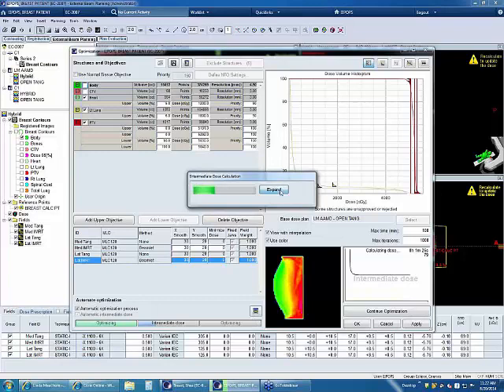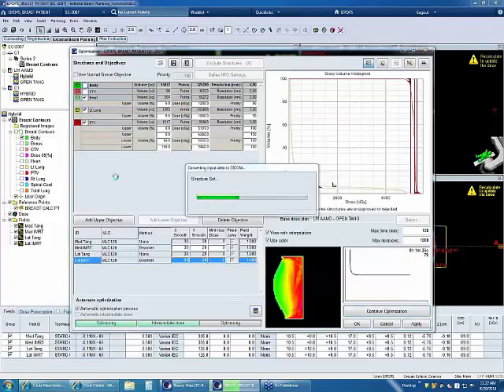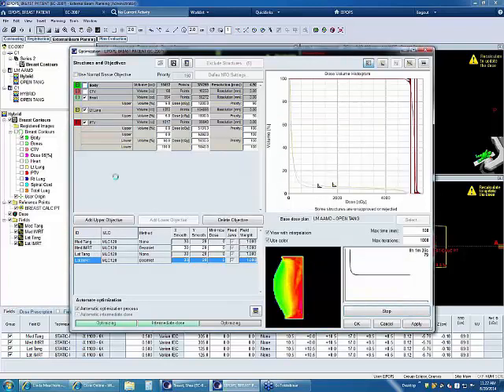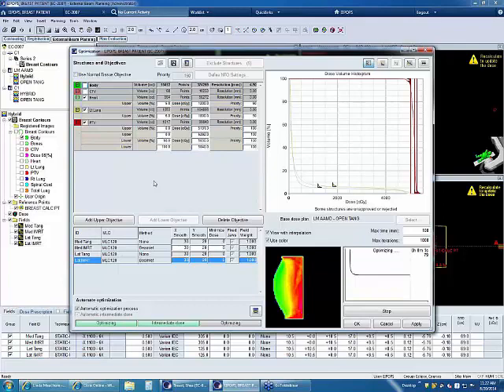If you expand this, all it's telling you, it looks just like a message box when you calculate your plan. So it's doing the intermediate dose calc, and then it's going to go back to automatic optimization process. And after it does that, once it's done optimizing, it's made its correction right here. The intermediate dose made its correction right here, and then once it flatlines out and it's done optimizing, it will throw it right into the leaf motion calculator.